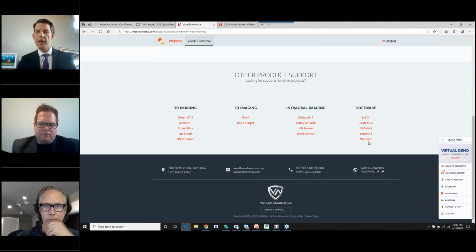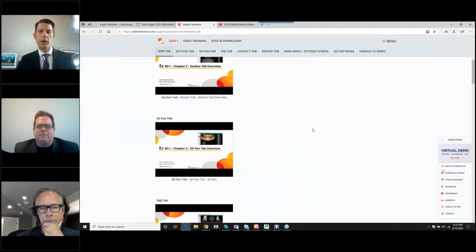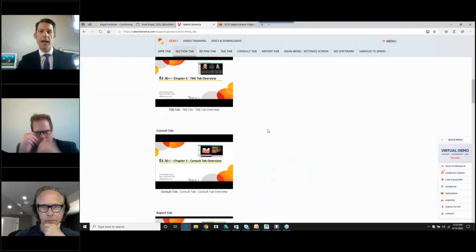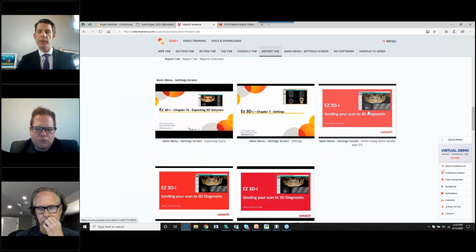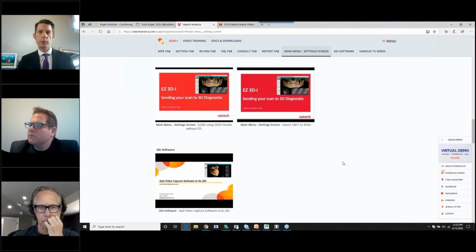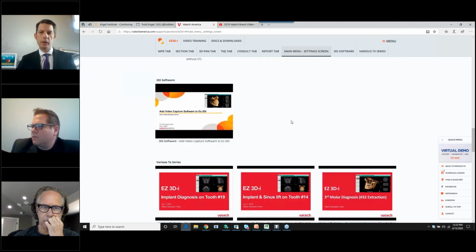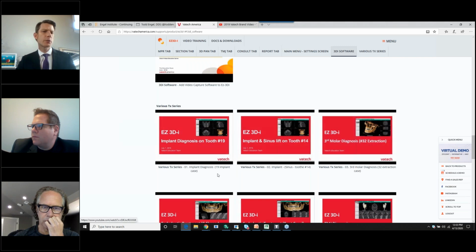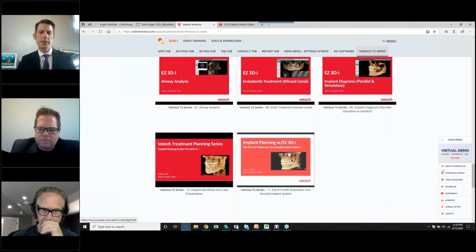So if I want to look at my 3D-i software, video training here, going all the way down through our 3D Pan tab, TMJ, reports, sending your scan to 3D-DX or 3D Diagnostics. We really like that one. We have that one in there 3 times. Third molar extraction. So a lot of things we've talked about. There's some clinical tools in here that you can use.